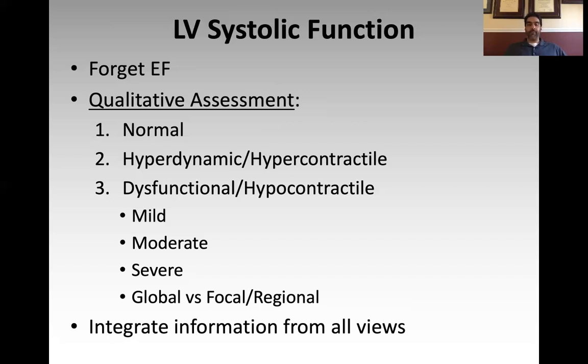So forget EF. What you should learn how to do as a critical care ultrasonographer is a qualitative assessment of LV function. And by that, I mean you should know what normal looks like from a qualitative standpoint, know how to identify a hyperdynamic LV, and know how to identify a dysfunctional LV. And within dysfunctional, start to get good at differentiating between mild dysfunction, moderate dysfunction, and severe dysfunction.